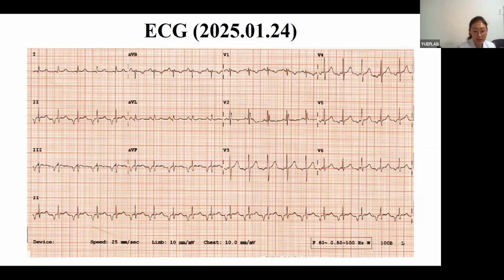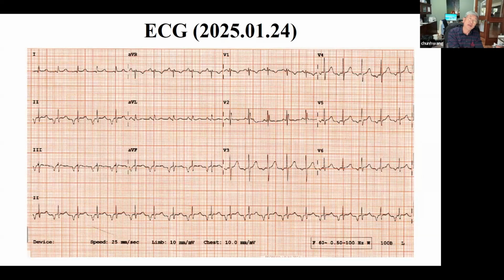I think it's not normal. Okay. So how do you differentiate this from a patient who has, let's say, rotation of the heart versus underlying conduction abnormality? Can this be caused by rotation of the heart, or is this an anatomically defective ventricular orientation? That's what I'm asking.